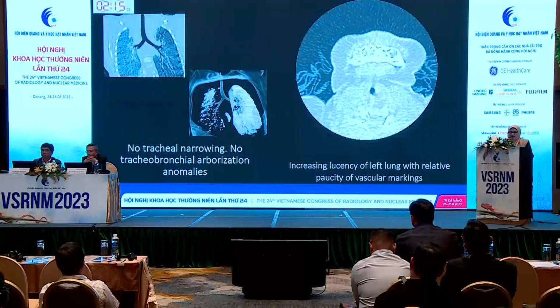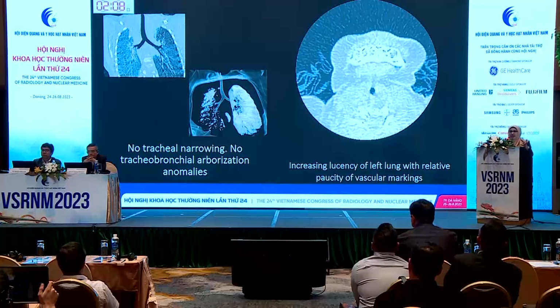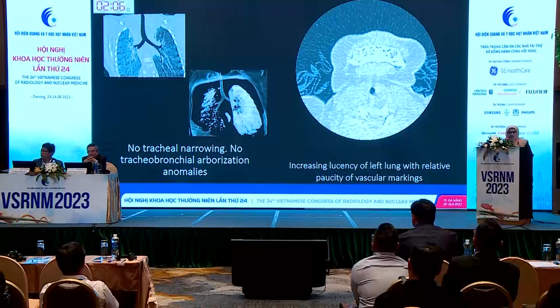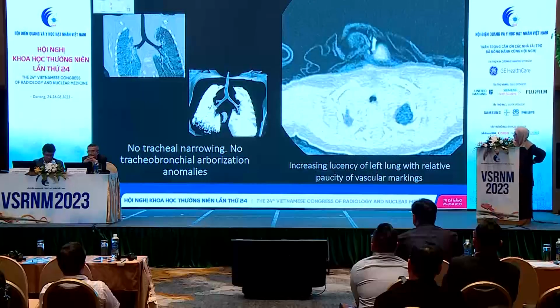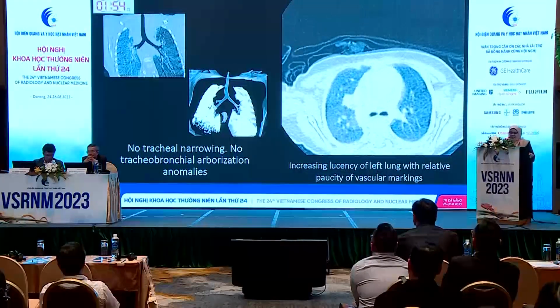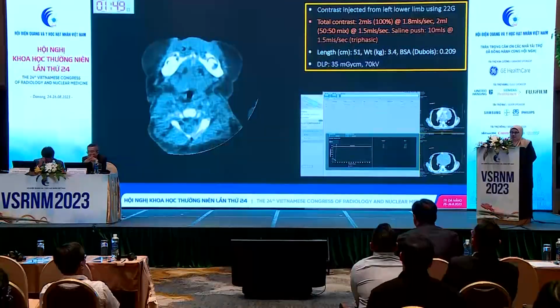And of course, since he presented with respiratory distress, we had a lung window for reconstruction, and we managed to show that there's no tracheal narrowing or tracheobronchial arborization abnormalities. Also, there is increased lucency of the left lung, with relative paucity of the vascular markings.